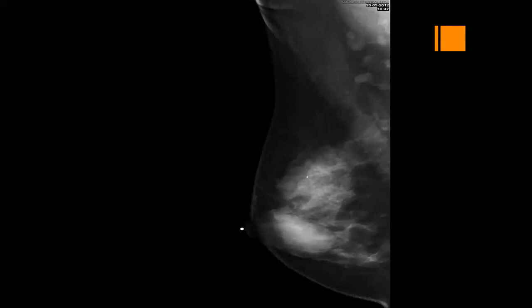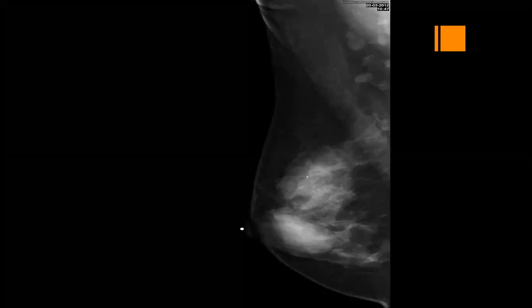Okay, so an oval, or partially oval circumscribed mass. Yes, circumscribed mass.